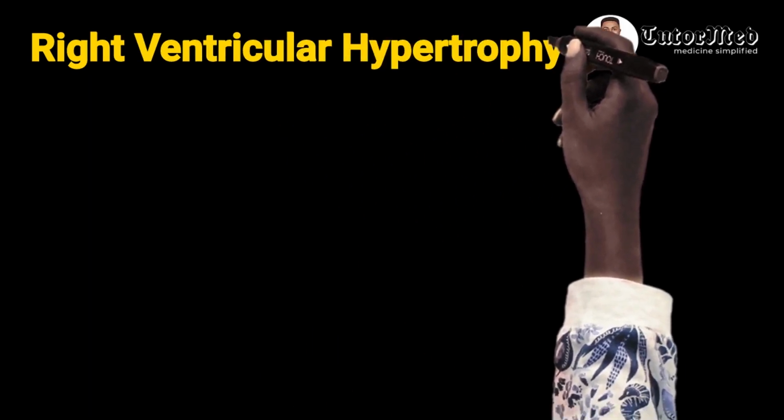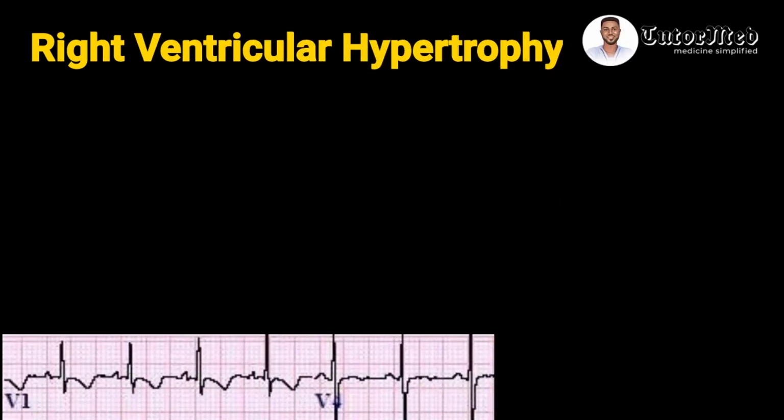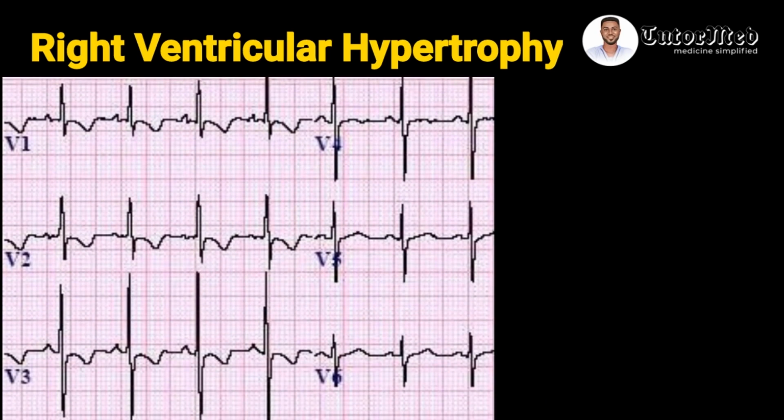Great. So now let's look at how to identify right ventricular hypertrophy. We will use this ECG reading to illustrate right ventricular hypertrophy. Now, like the left ventricular hypertrophy, there are many methods to identify right ventricular hypertrophy, but a simple and common method is to pay attention to the QRS complex in lead V1. As you know, usually in lead V1, the S wave is more than the R wave. It means in lead V1, the QRS complex is predominantly negative. If this changes, there is a problem.